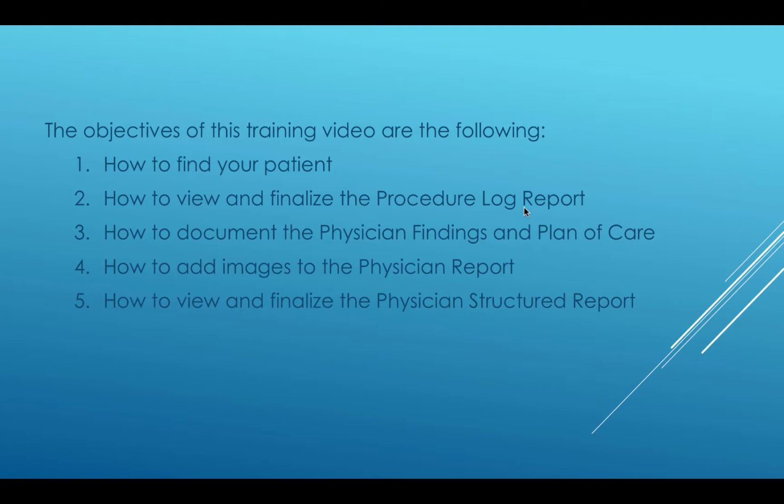If you have already viewed and completed the cath structured report training for the right-left heart cath, you can jump to Section 3, How to Document the Physician Findings and Plan of Care, which will be specific to a peripheral case.